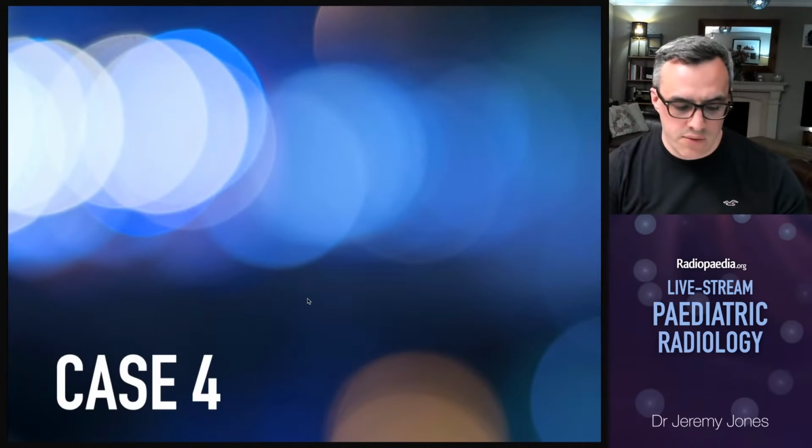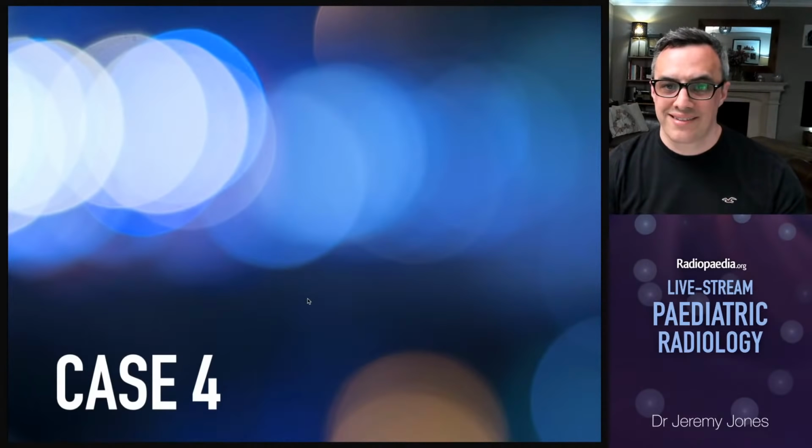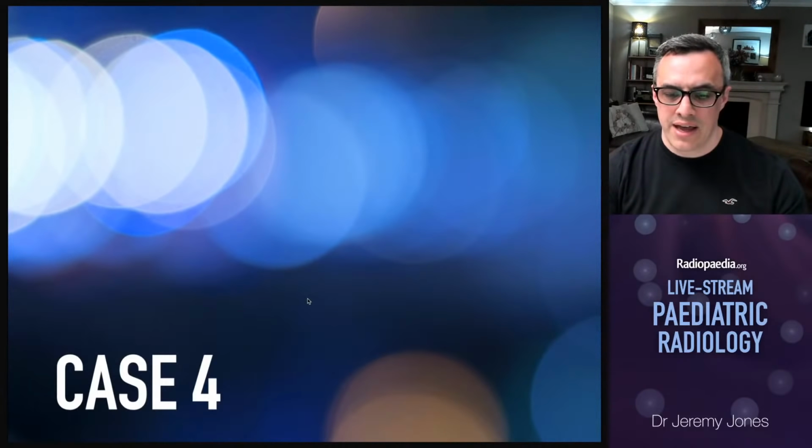Interestingly, actually, I recently uploaded the next set of imaging for this patient because she comes back years later with knee swelling and a flare of her JIA with widespread synovitis.